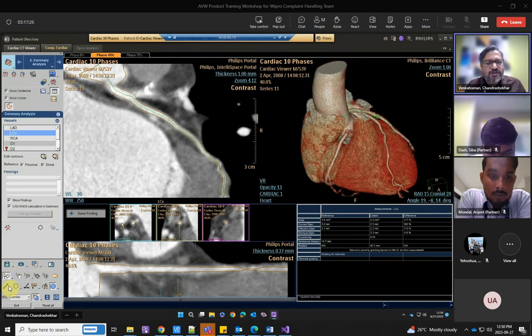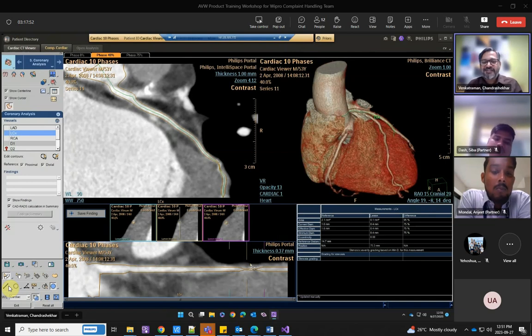Whatever is behind the particular stenosis reference point is called proximal, and what is in front is called distal. In these references, I can hide or show proximal and distal as a reference. If you want to come over here, at this stenosis point, all I have to do is hold Control and click. The markers just jump to the stenosis point.